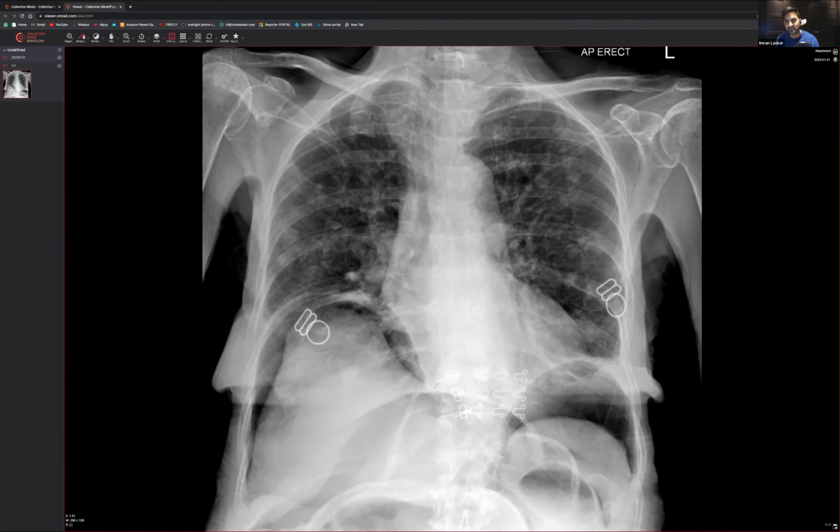Some of you may have also noticed that that bowel looks a little bit abnormal. Can you see how it looks like it's kind of pushing upwards? Yes, you can see some haustra, but you've got to be worried that, first of all, you've got multiple metastases, you've got air under the hemidiaphragms and what looks like potentially dilated small bowel. In that situation, you wouldn't be untoward to say, this might be an underlying colonic carcinoma that may perforate and result in air under the hemidiaphragms, and this patient's quite far staged because they've got multiple metastases.